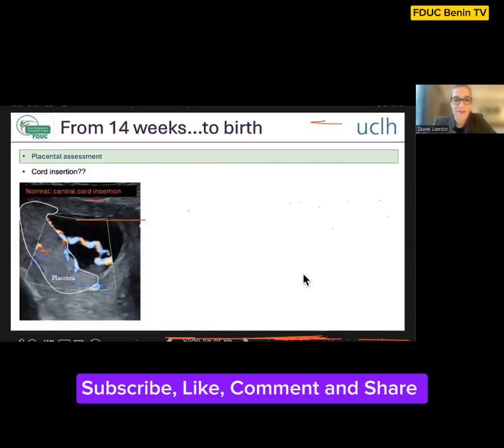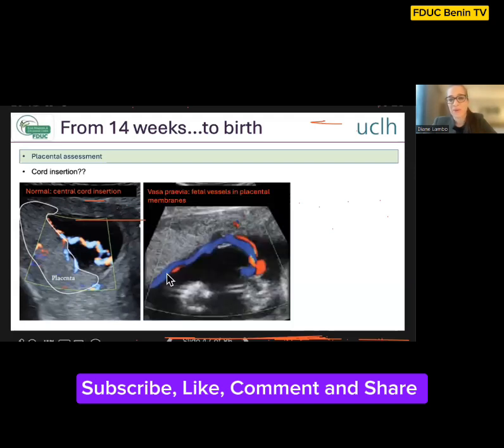Now, normally, as you can see here on this picture, the cord inserts into the central bulk of the placenta. So this is a normal central cord insertion. What are the abnormalities that you're looking for? Essentially what you're trying to rule out is a condition called vasa previa. And a vasa previa, for those who haven't heard of it, although I'm sure most of you have, is where the fetal vessels are running unprotected in the fetal membranes.